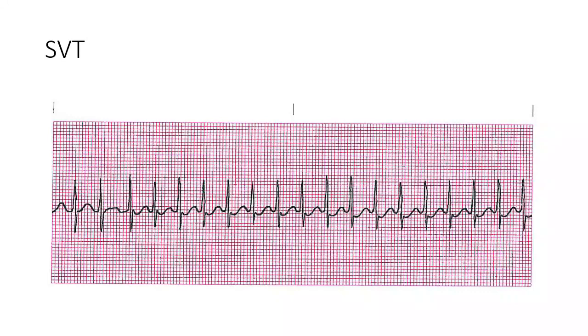One of the tricky things with AFib that's really fast is that the faster the rhythm, the more regular it gets. And obviously, we can make an argument that maybe we see a P wave up there. But again, if you've got a patient with a heart rate of 180, you're probably not going to see a P wave as well.